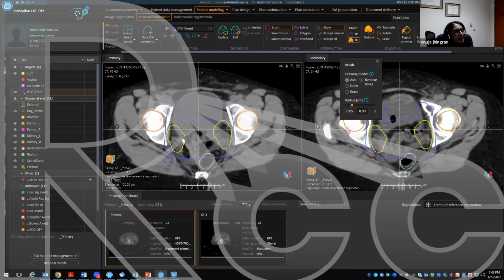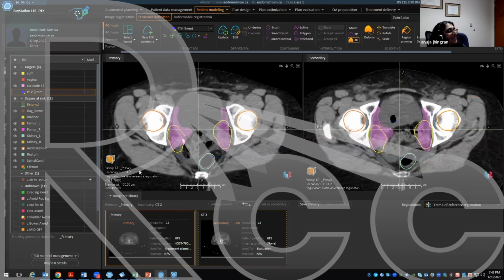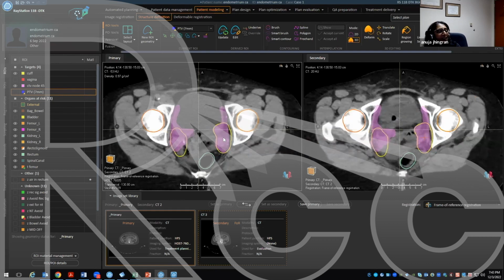100%. So in this case, and you know what? I wonder, oh, this is the PTV. That's why you were looking at it. I'm sorry. So that was what the problem was. I was trying to figure out why. So this is the PTV. So let's not look at the PTV. Sorry. So you can see where I did it before.